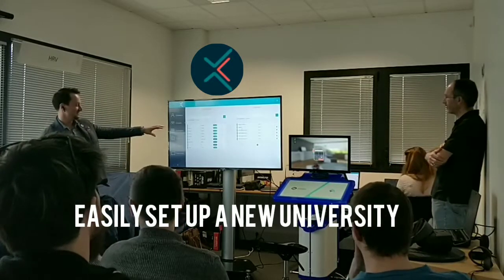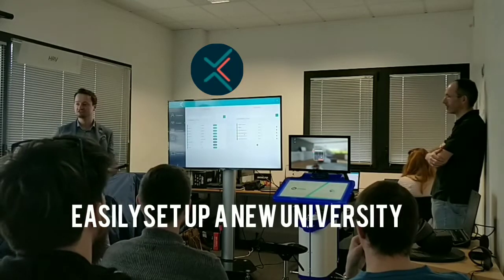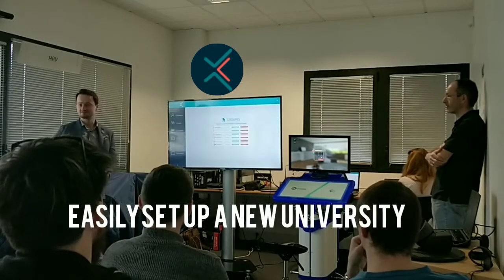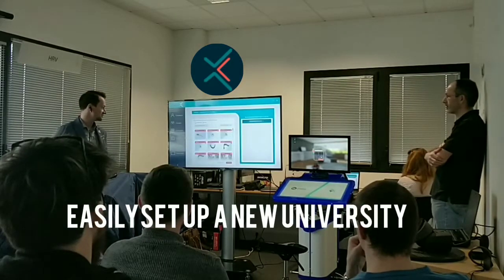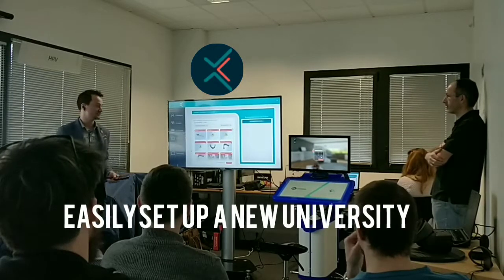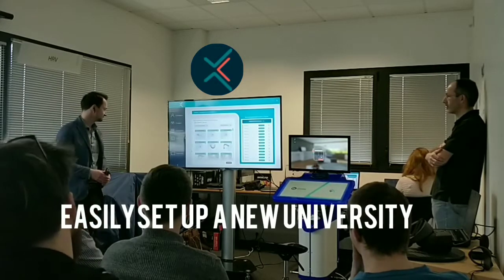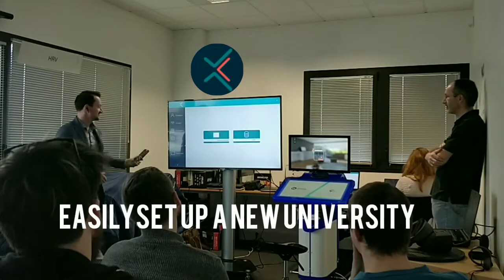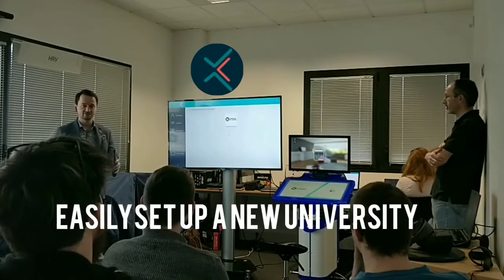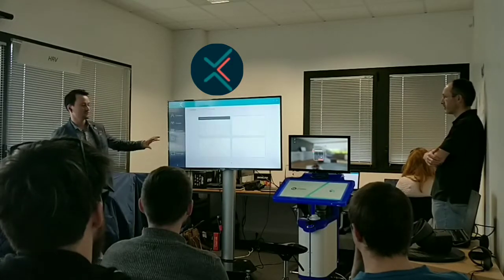So what we're doing here, we're just creating a new group. This can be used for the year groups, it can be used for different classes, for endodontics, prosthodontics, implantology, etc. So here we're going to give access to all of the exercises that are available to our Marvel group for Tony Stark. Fantastic. So here we can set up the logo for the university, nice and easy for the first time setup. And afterwards we can even broadcast all of the simulators.